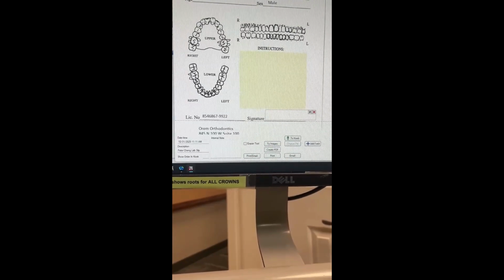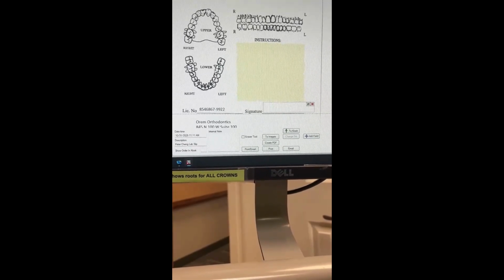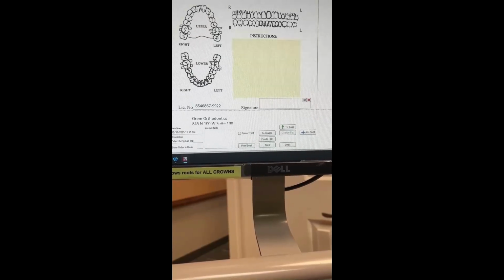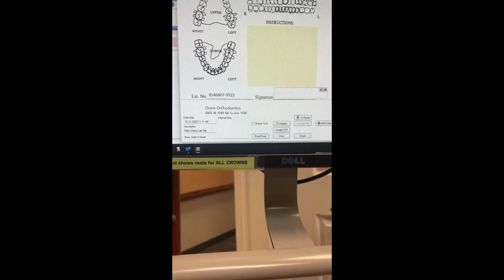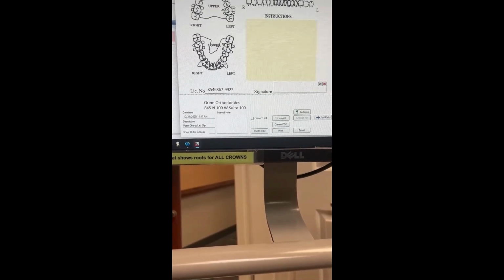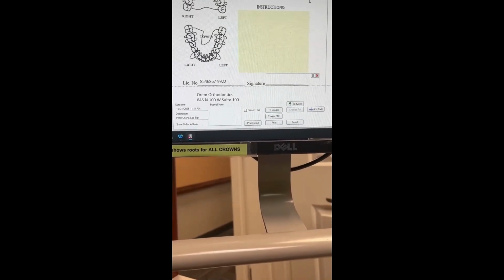And then I'll write the description as well. It's kind of hard with the mouse, so it looks kind of dumb. Yeah, not a very good drawing, but anyway. So I'll draw my standard retainer thing on here. The same thing here. It's a horrible drawing with this mouse.